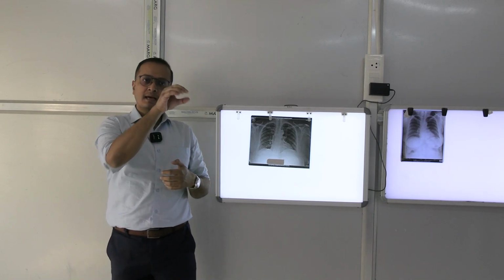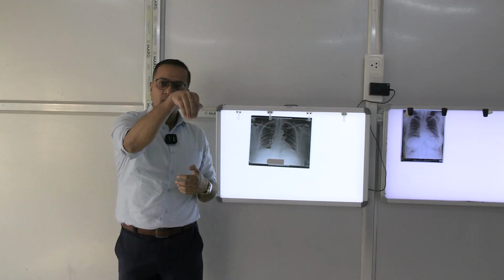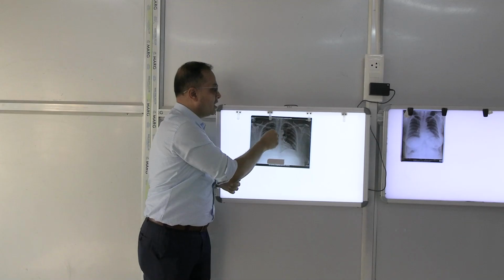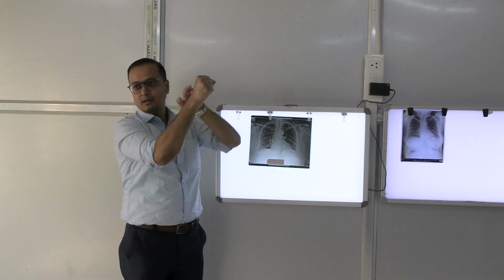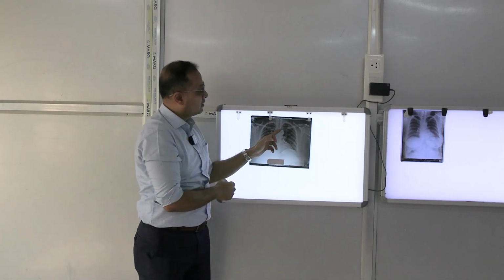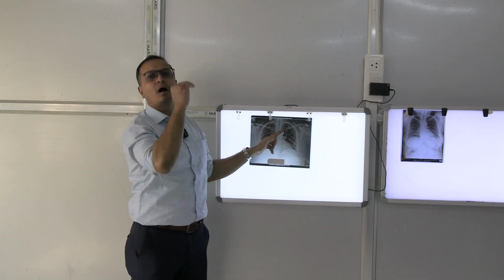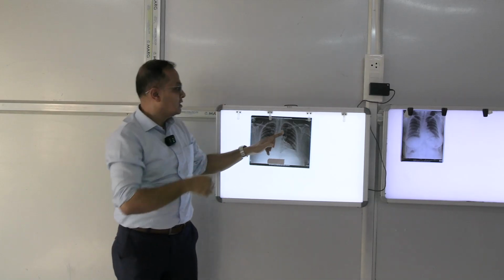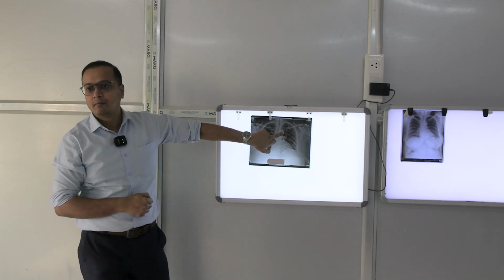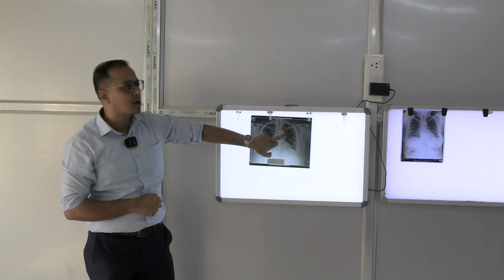As it is moving backwards, it makes an elevation, just like a hunchback. It is curving backwards like this. This backward curving arch makes an elevation that looks like the knuckle of a fist. This knuckle-looking hunchback is made by the arch of the aorta as it arches backwards. So this knuckle or elevation, we call the aortic knuckle, made by the arch of the aorta. The aortic knuckle makes a bulge over here, and with these markers you can trace it.